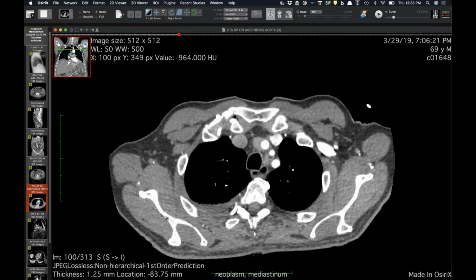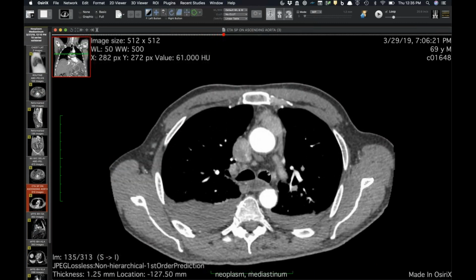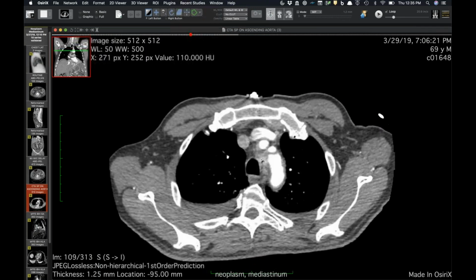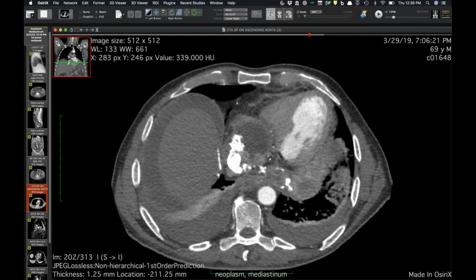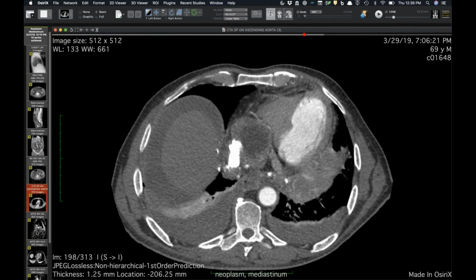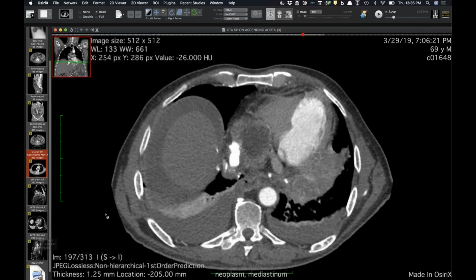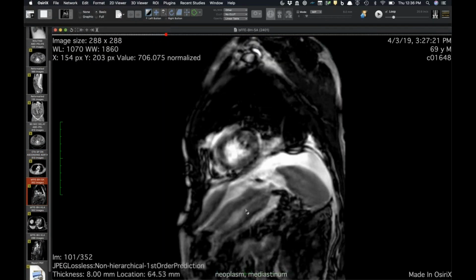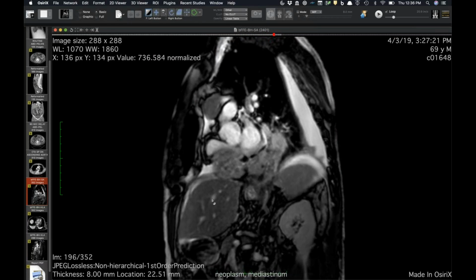So we did a CT though of the chest the next day, and I think this kind of removed all doubt. He had a few nasty looking lymph nodes. You can see anterior mediastinum and then left paratracheal region here. And it was still hard to really guess where this was coming from. I thought maybe it could be like some sort of mesothelioma from his pericardium, some sort of weird sarcoma. They didn't really need to do an MR, but they did it anyway. And you'll see on the cines that it looks like it's just exerting mass effect from underneath the heart.